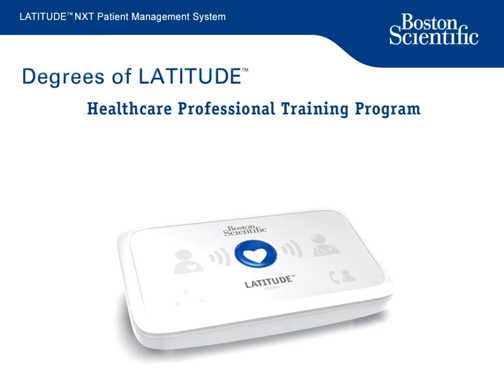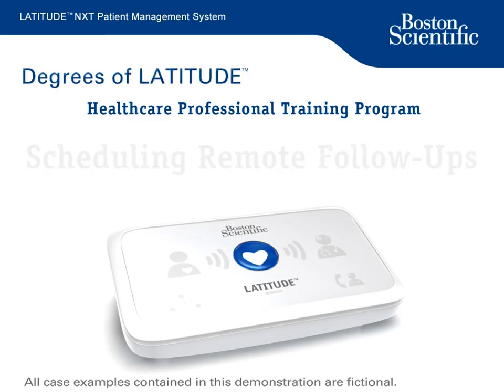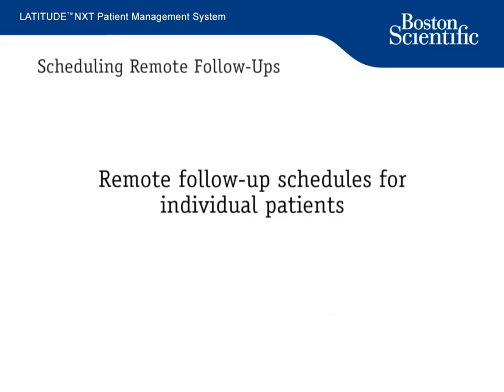The Latitude NXT website offers you flexibility and control over how you receive, review, and manage Boston Scientific device and patient data. In this training module, you will learn how to set remote follow-up schedules for individual patients and patient groups in Latitude NXT. Let's start by exploring how to set remote follow-up schedules for individual patients.